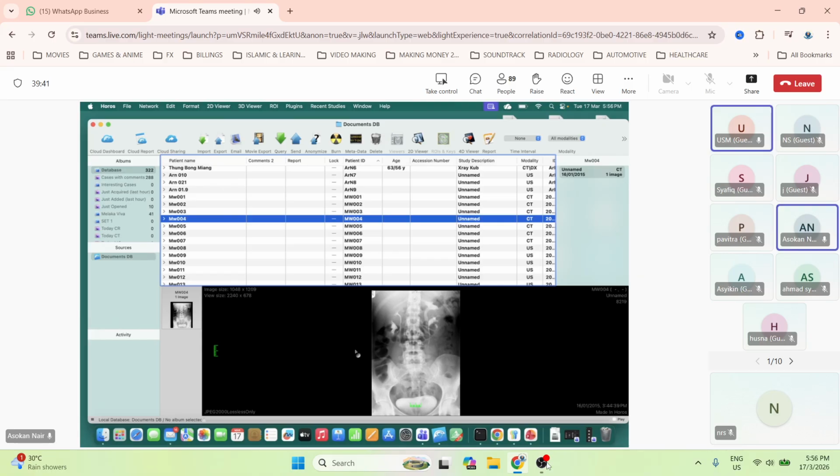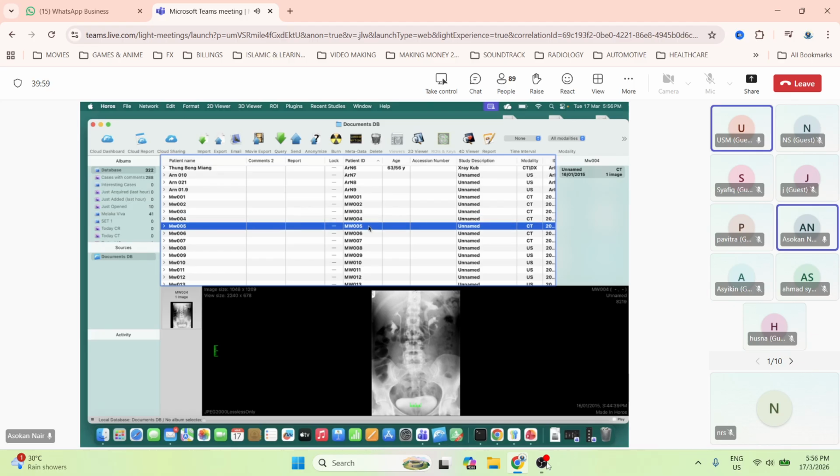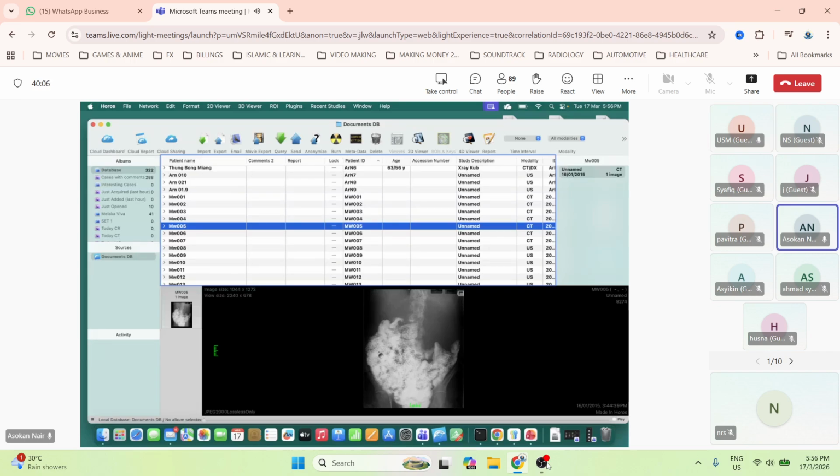All right. So sometimes you don't see excretion in the upper moiety because it's completely obstructed. Then when you do an ultrasound, you'll see the duplex. One is markedly hydronephrotic, so not excreting. So always when you see duplex systems, combine it with an ultrasound. Sometimes they show you an ultrasound only and then move on to an IVU, okay?